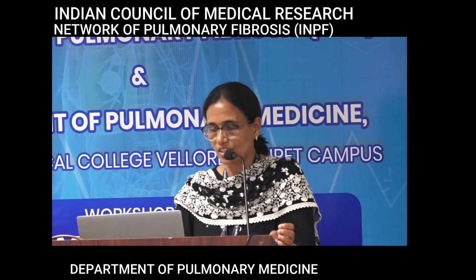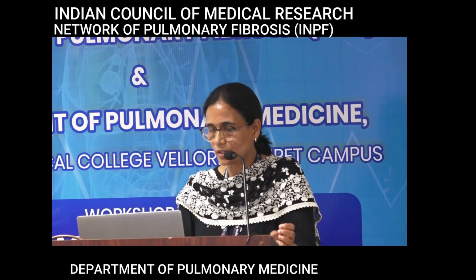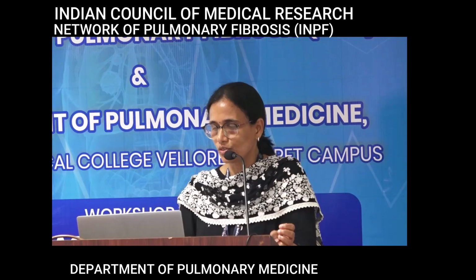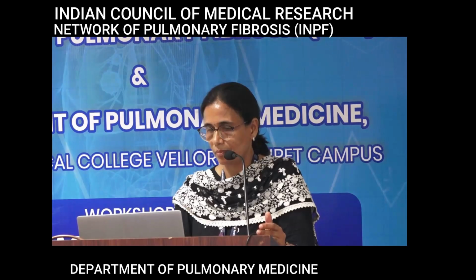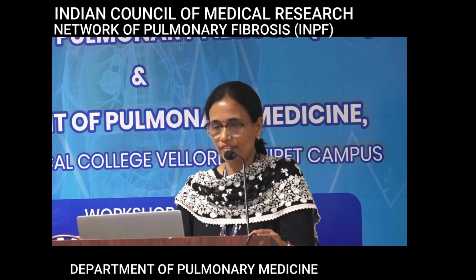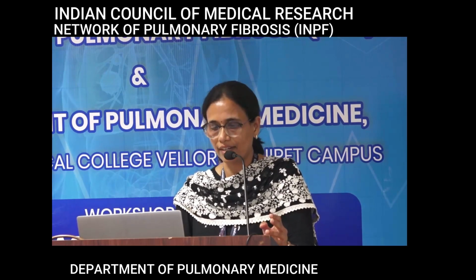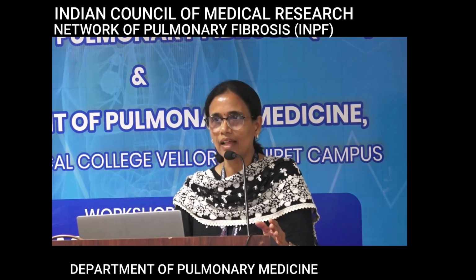So how do we say it is central lobular? We are seeing all evenly spaced nodules, and they are just away from the pleura, and some of them are almost having a branching kind of appearance. So once we see these profuse nodules, it is an alternate diagnosis in that IPF paper. So how do we approach the nodules? First thing is we look at the pleura and fissures. Are there nodules there or not? If yes, is it predominantly along the pleura and fissures? If yes, it is a perilymphatic distribution, and the typical things that we know are sarcoidosis and lymphangitis.